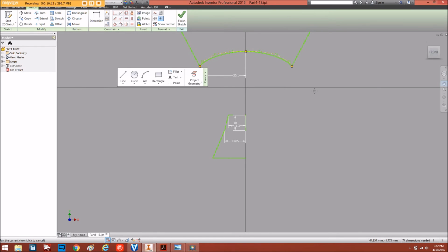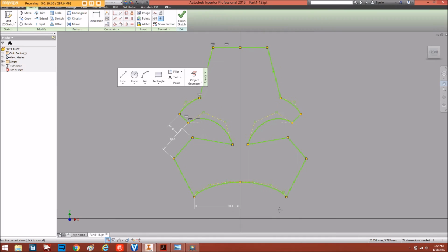Let's go back up here for a second. So here's how it looks at the end. All right, and I give you a little curve form here. Well, you can see where actually the measurements are. The system will soften them, making more of a low curve, because that's why I selected that instead of right acute angles. And it's okay. It will be easier once you use it for your surgery.